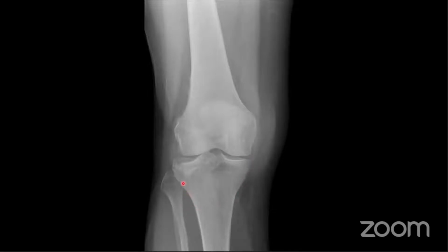If you follow the proximal tibia, maybe if you get here, there's a little step and a little lucency. And maybe if you look here, there's a step and a little lucency. But the finding that makes you more convinced that this is definitely a fracture is that this bit of bone looks denser than normal, and there's disruption of the trabecular pattern here. Again, if you compare to the other side, there's very regular, straight trabeculae, and down here as well, but they're disrupted here. So this has to be a fracture.